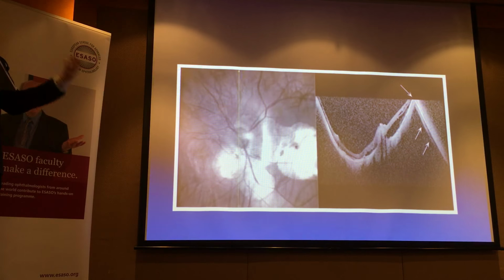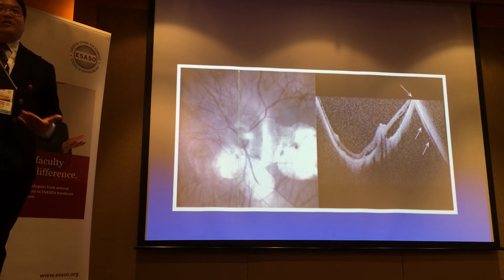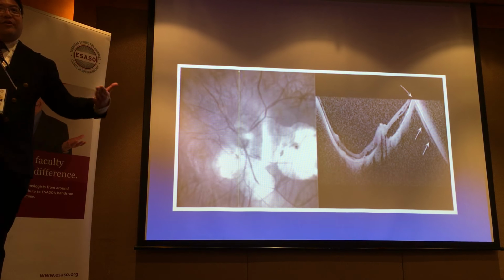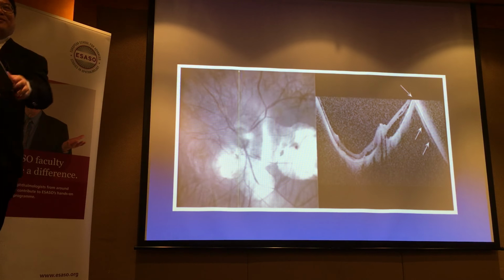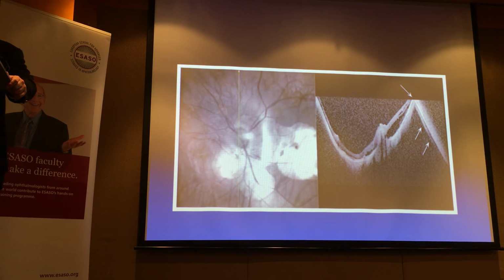It's like the Earth, right? The Earth is round, all right? Unless anyone wants to dispute that. But when we are walking here, we don't feel it to be round, is it? Because it's a very small part of the whole surface. So that's one of the tips. Here's a case where I would advocate narrowing the width of the scan. I can be flexible; I'm not always of the view that bigger is better. So that's one of the things you've got to watch out for. But as long as you recognize this, then that's fine.